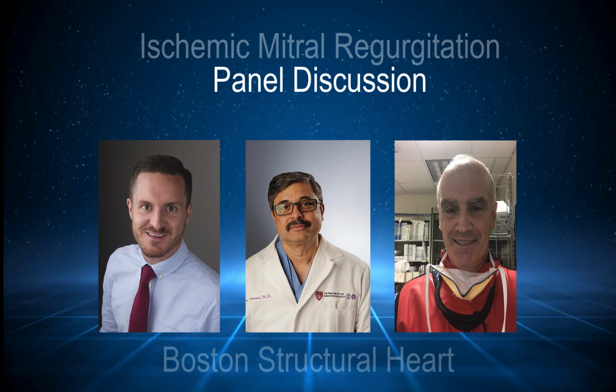Now what's interesting in these kinds of patients is your first thought, well, of course the mitral valve area is going to be just fine because it's not rheumatic disease or anything like that. And there's actually a lot of diastolic restriction of the leaflets. These valve areas might not be 6-7 centimeters squared like some of the flail leaflets might be, and some of the more mobile leaflets. You might be fairly unhappy to see that your valve area might only be about 3.5 to start.